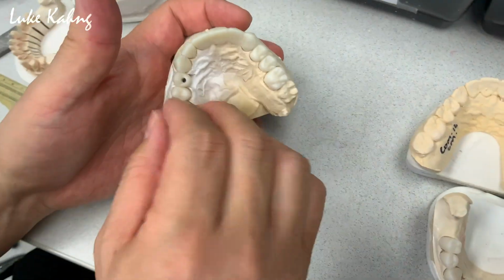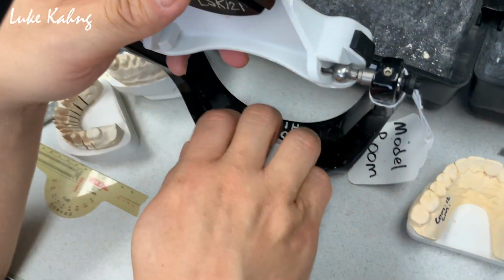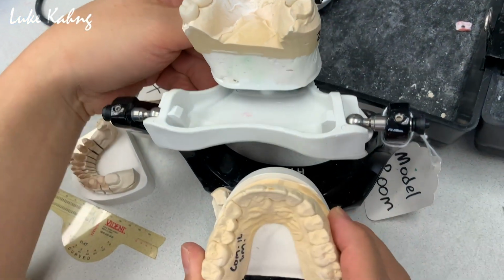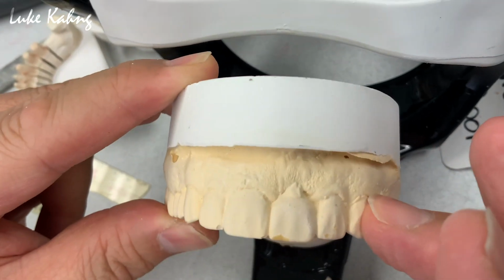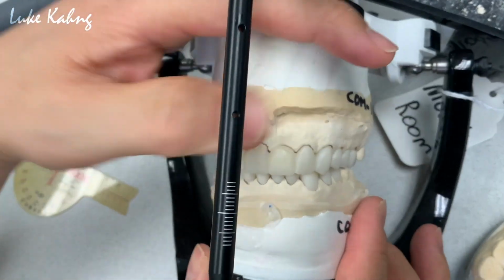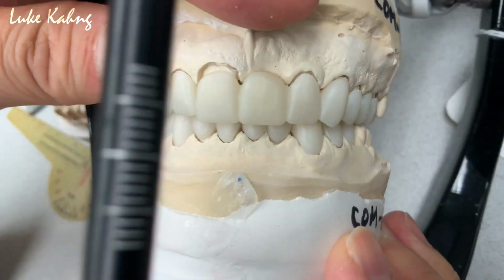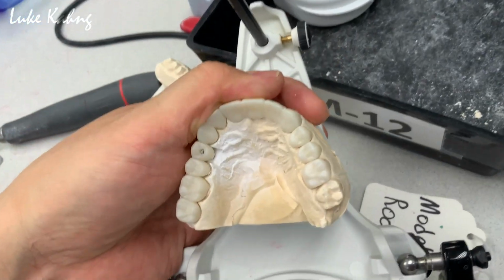Okay, so whatever we do here with the mounting, with this, and then here, because it's all about the guidance here, which the doctor presented. All right, this is the guidance. Without guidance, sometimes we cannot do it. All right? So we make sure of this, and here is white, and then we can double check. There's the final one. All right, so here is the occlusion.